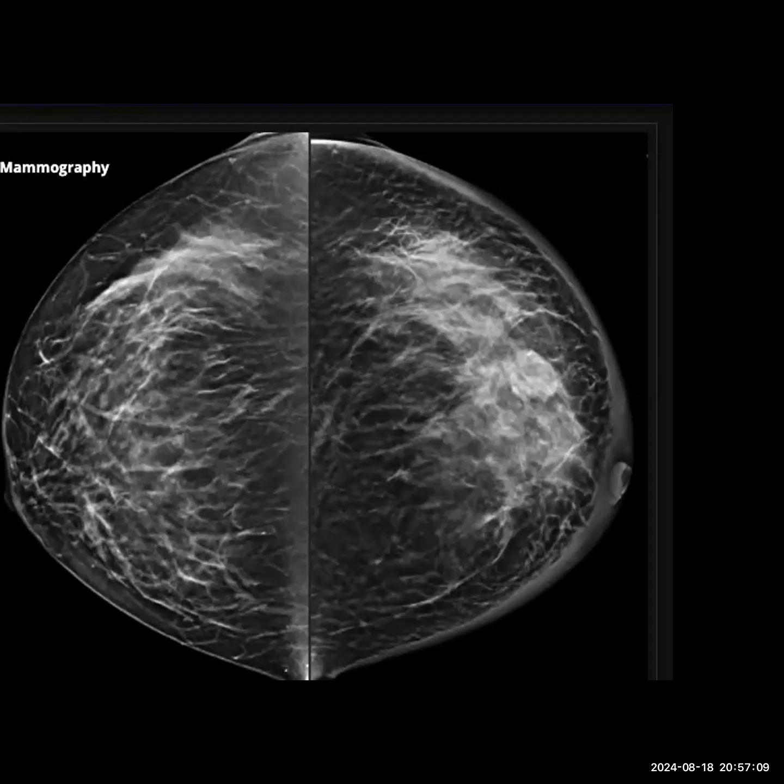Okay, I'm provided with the craniocaudal views. I think it is quite zoomed up. Can you please zoom out? Zoom out, okay. Yes.